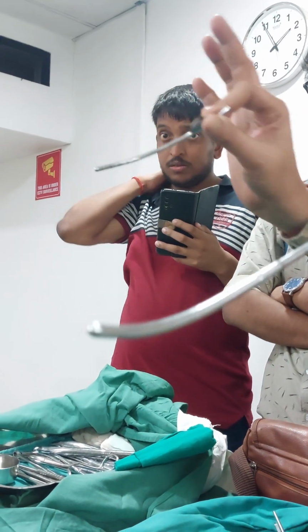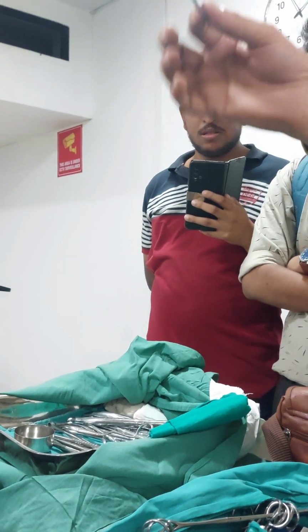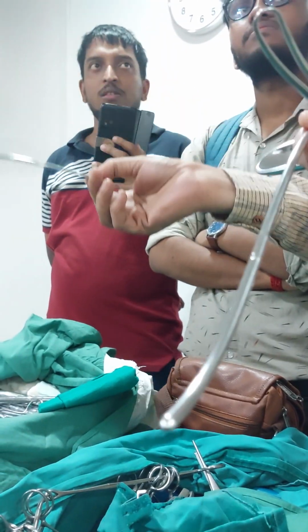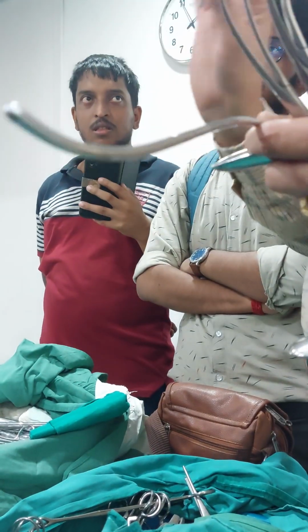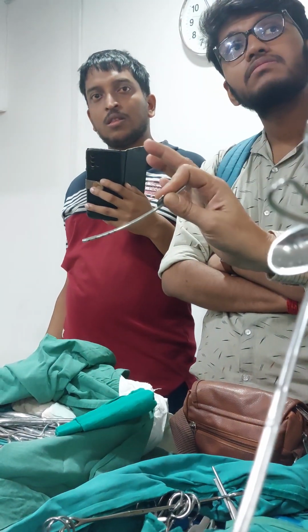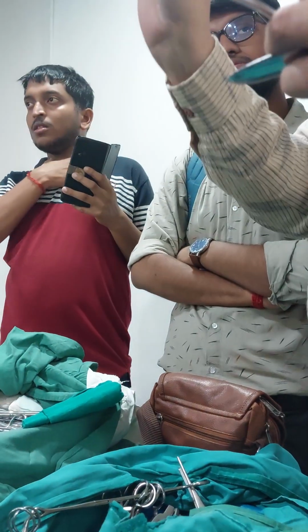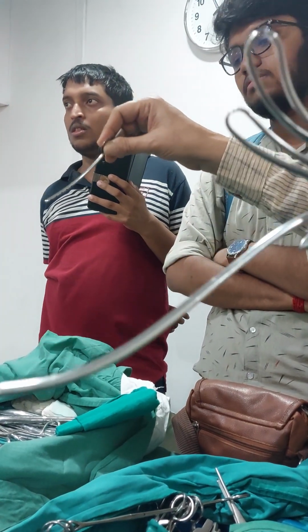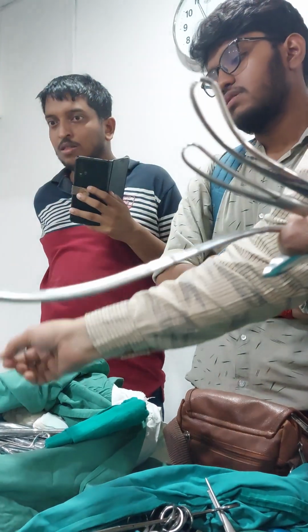Before any procedure, either D&C, D&E, suction evacuation, or any pelvic surgery like vaginectomy, we have to evacuate the bladder beforehand. Even before application of forceps, 4 criteria have to be fulfilled. The bladder has to be empty, the cervix has to be fully dilated, the presentation has to be vertex or after-coming head in breech, and an episiotomy has to be given. Then only can you apply the forceps. So this catheter is used only to drain out the urine. There is no other purpose.